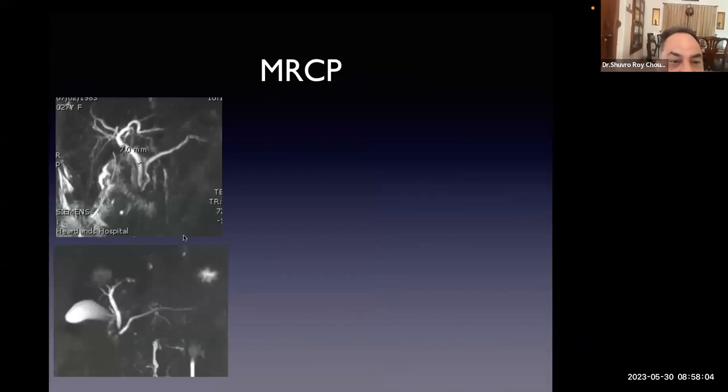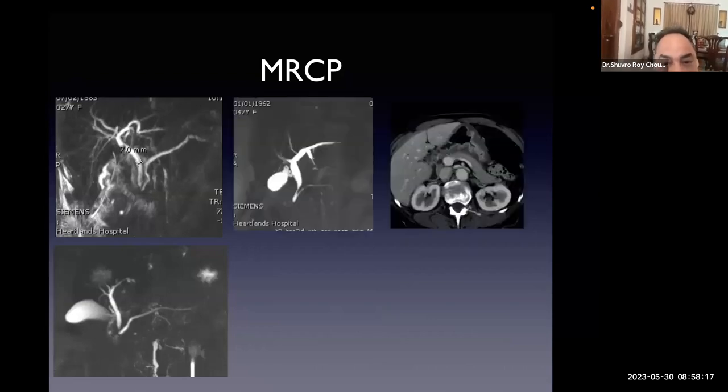So here is a typical MRCP. You can see the bile duct, you can see the pancreatic duct. This is what I was talking to you about, poor ampullary visualization. See the. So what is the etiology of this, do you think? This sort of picture on MRCP.